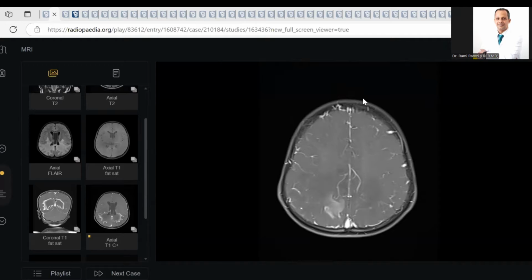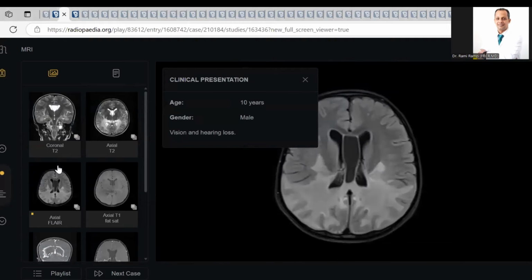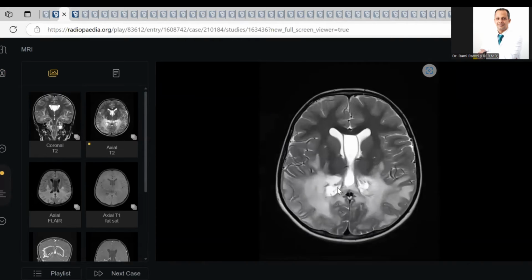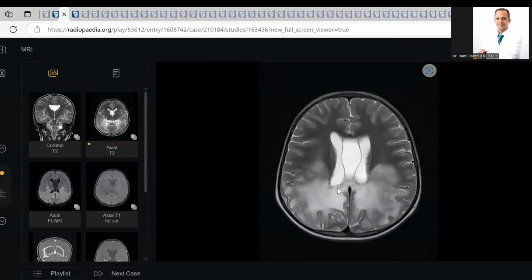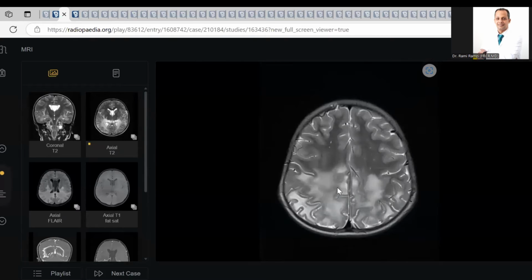Let's continue our session. Case number one, startup case. Looks like a difficult case, but you smashed the case very well. Bilateral symmetrical butterfly, mainly posterior. Signal abnormality white in young age. Posterior means adrenoleukodystrophy. Very good, Doctora, first candidate.